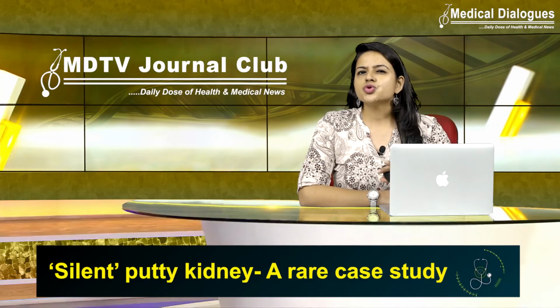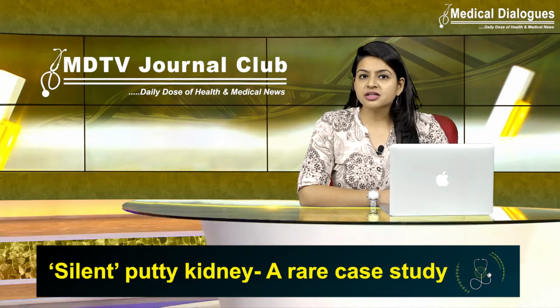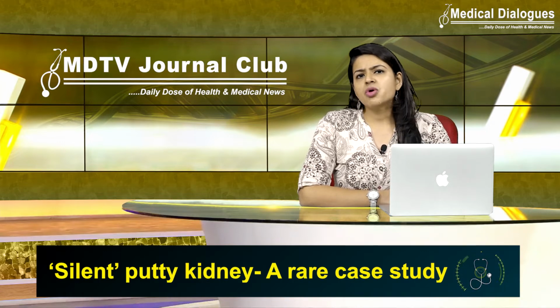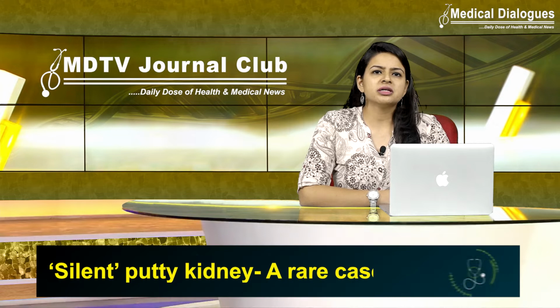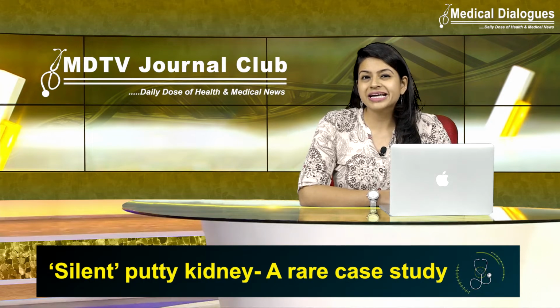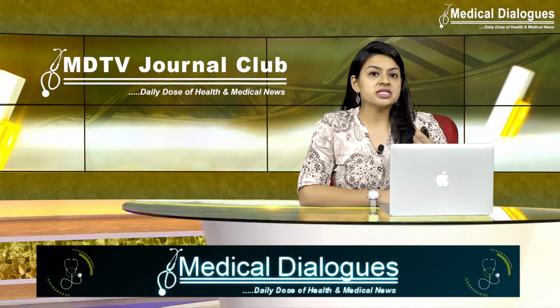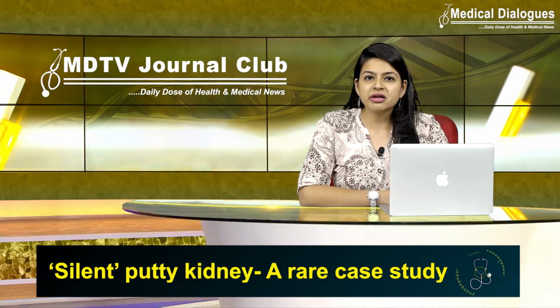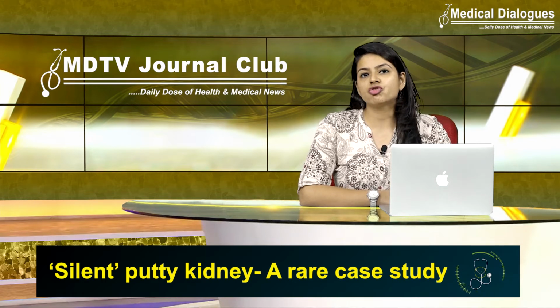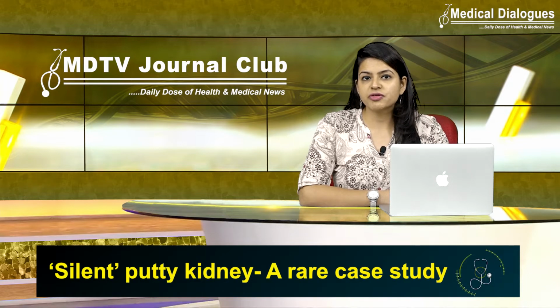A diseased kidney shows many different alterations when seen on a radiograph. Now, one such is the putty kidney. Now, what is it? This is a radiological appearance of dense dystrophic calcifications, often involving extensively damaged kidneys due to tuberculosis. Now, it is usually the end result of scarring, obstruction, as well as the atrophy of the kidney due to TB, which is complicated by dystrophic calcifications over a period of time.